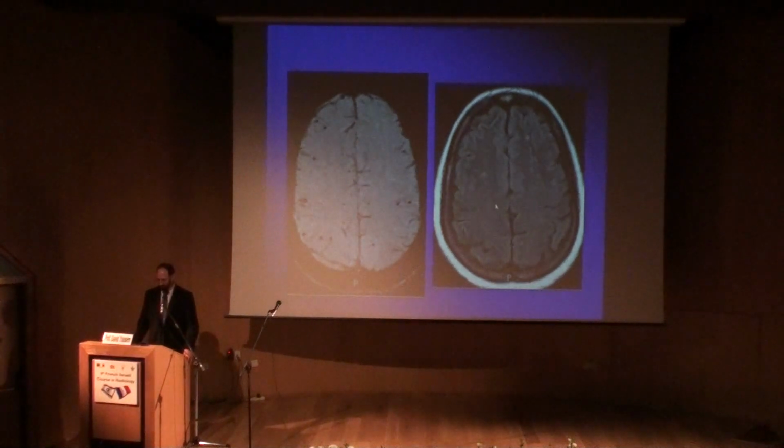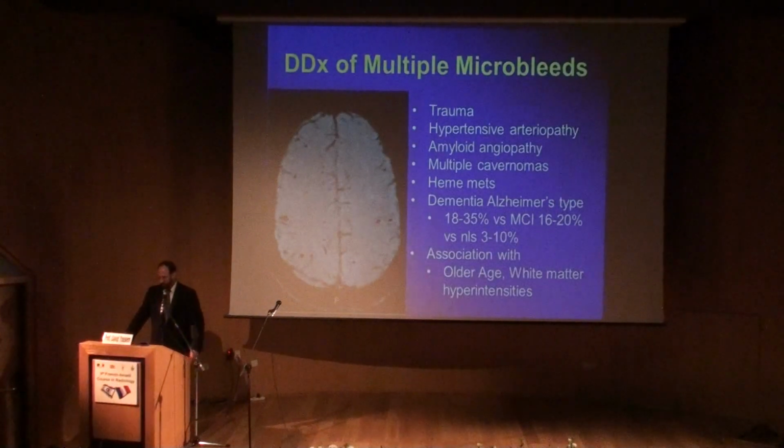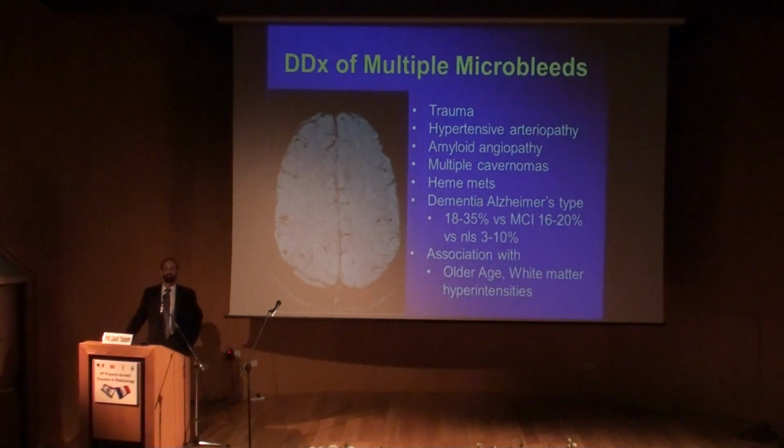It certainly is much more sensitive than, for example, relying on a FLAIR scan for a trauma patient. You might say, oh, well, there are some white matter lesions here. Are these from shearing or whatnot? And here you have the SWI, where you see at the gray-white junction these focal areas of blood clots that are not evident on your associated FLAIR scan. In fact, we now have a differential diagnosis that gets expanded because of our increased sensitivity to these blood products.